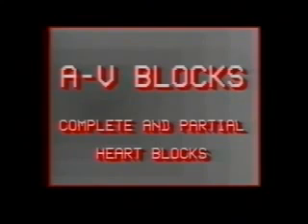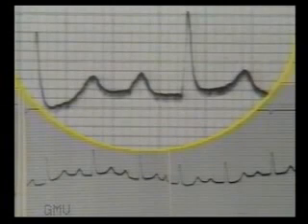AV block, complete and partial heart blocks. First degree AV block, or first degree partial heart block, is a block in the AV node. In this ECG, measure the PR interval. It is 6 small squares, or 0.24 seconds.